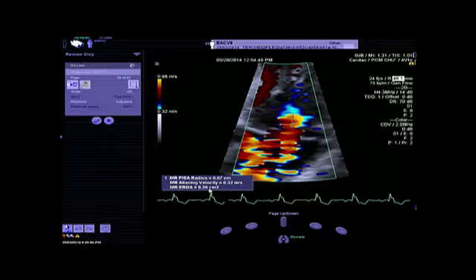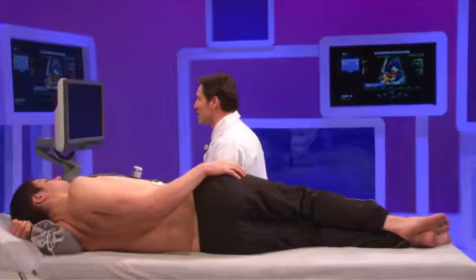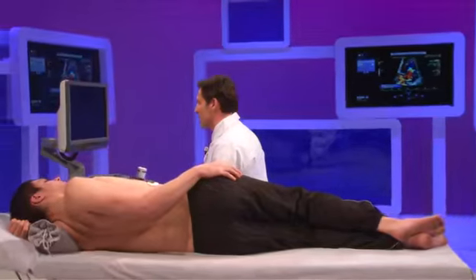But in mitral regurg and in primary, we can use two different cutoffs in the moderate part, the mild to moderate and the moderate to severe. And in these patients, we have moderate to severe mitral regurgitation. So now, what are the next steps that we could do in the patients with a mitral regurgitation to assess again the severity of the mitral regurgitation?